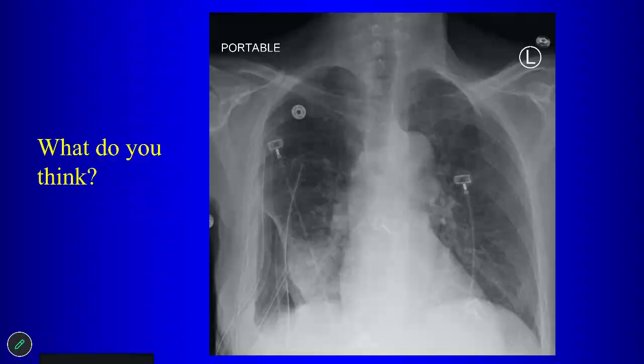Visceral. It's the visceral pleural thickening that prevents the lung from expanding. Okay? Is there evidence of visceral pleural thickening on the chest radiograph? Yeah, it's, you see, what do I say? It's like the density, right? Increased density. See this line right here, radiopacity. That's the visceral pleura. That should be pencil line or pen line thick, right? It's very thin. That's what we look for when we see a pneumothorax. You look for that line of the visceral pleura. This is too thick. So there's visceral pleural thickening here. The lung's not re-expanding, so we're thinking then that this is a trapped lung.